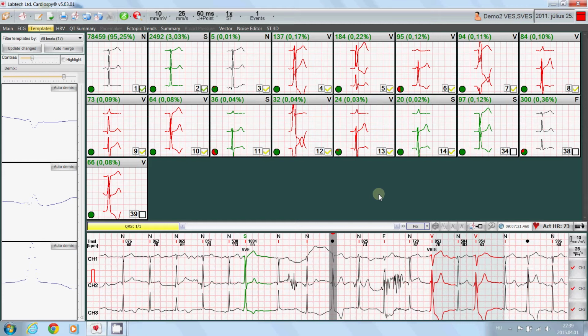Just to briefly summarize what we've learned here is that it is very important to correct the templates, because all the subsequent analysis relies very heavily on templates, and if they are incorrectly grouped, then this incorrect grouping can cause serious issues in the further steps of the analysis.